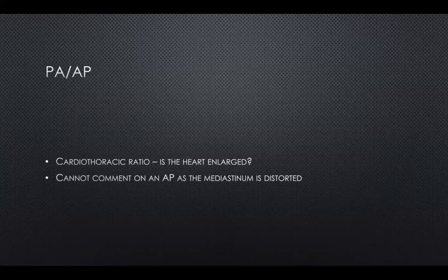And you've got your PA or an AP. So your PA chest radiograph is your normal, typical radiograph. And then an AP is more for your unwell patients that aren't able to stand, and have a normal penetrating chest X-ray from the front to the back. From the back to the front, sorry.